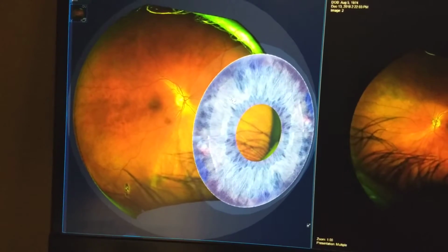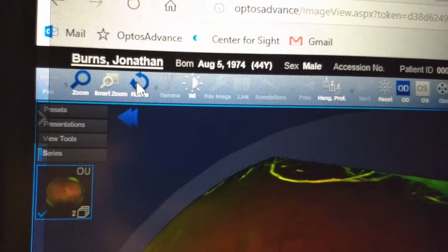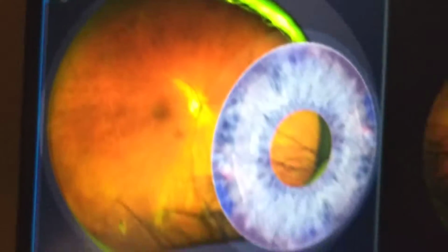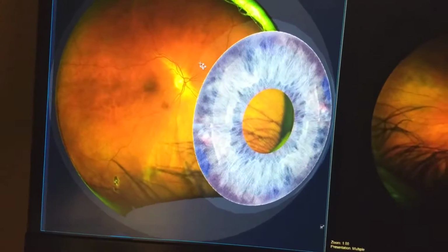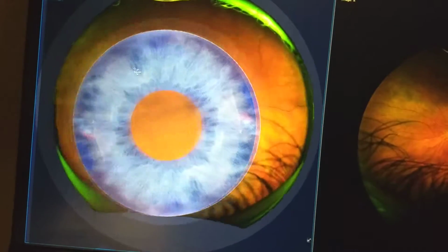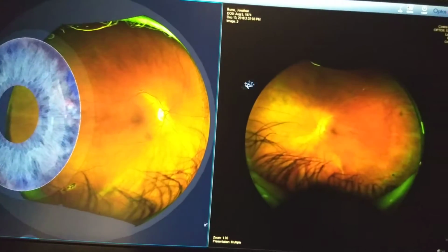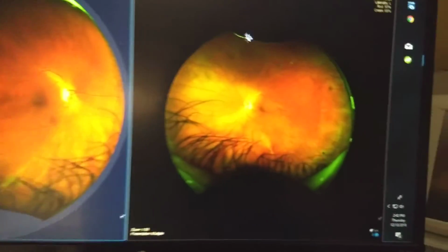And in order to move it around, you have to go up here to the rotate button, and now you can help them understand it better by moving it around like that. And then the only way, you can't X them out, the way that you X them out when you're all done is just to come up here.